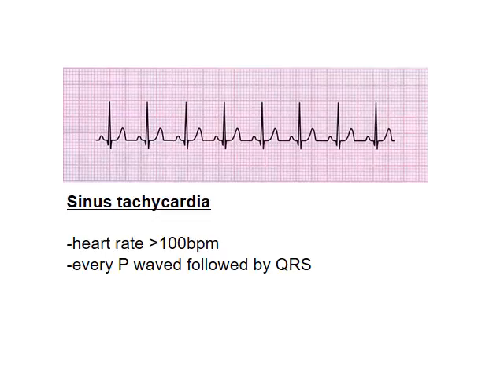Again, depending on the technique you used will determine the answer you have. If you use the large square technique, then you'll have worked this out at around 150 beats per minute, with just over 2 large squares between each R interval. If you use the small square technique, then I counted about 12 small squares between each R wave, and this is 125 beats per minute. For a fast rhythm, I would always be wanting to use the small square technique.